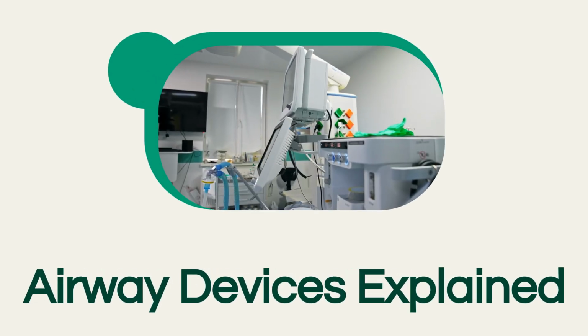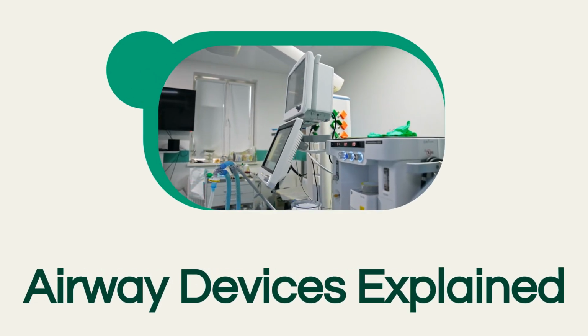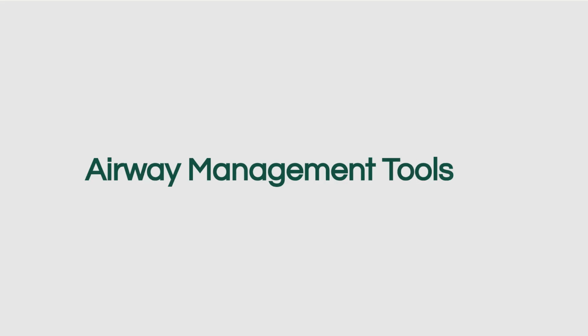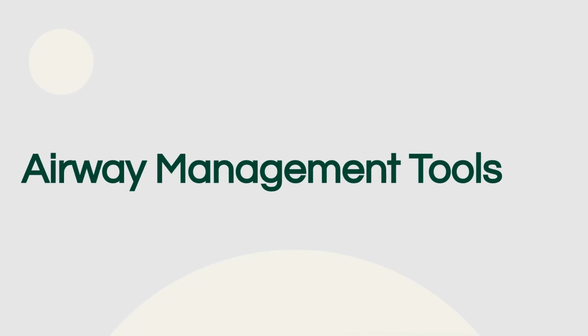Welcome to our essential guide on airway devices. We'll cover everything from face masks to the critical endotracheal tubes. Airway management is foundational to medical practice. Let's start with the most common and non-invasive tool, face masks.